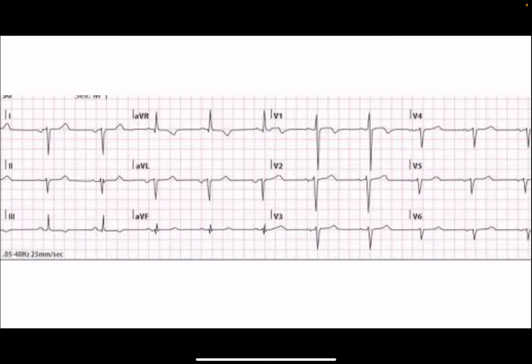Now see this ECG here. What happened again? Same, the P wave is inverted in lead one, the QRS complex is negative. But here, see what happened to the precordial leads. In precordial leads, the R wave height gradually decreases from V1 to V3, and you can also see QS type of complexes with loss of R wave in V5, V6. This is a dextrocardia ECG.